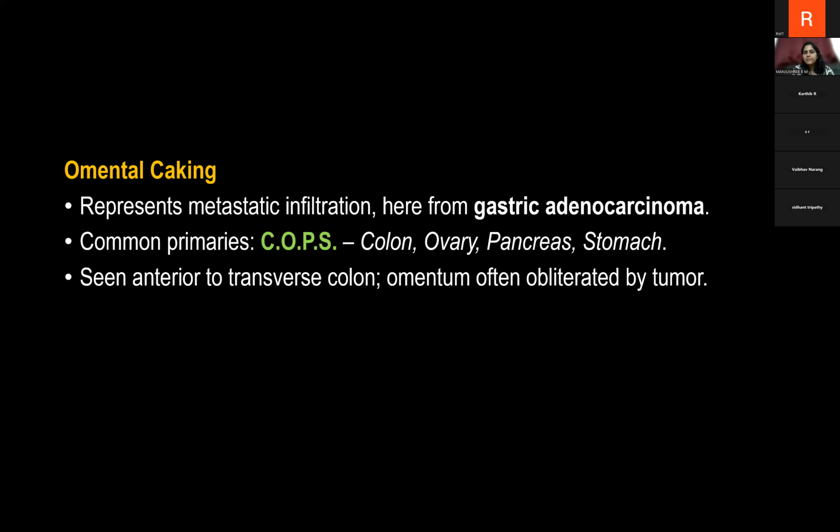It represents metastatic infiltration from here in this patient from gastric adenocarcinoma. It can also be seen in CA colon, ovary, pancreas, and stomach. It is seen anterior to the transverse colon, and omentum is often obliterated by the tumor.